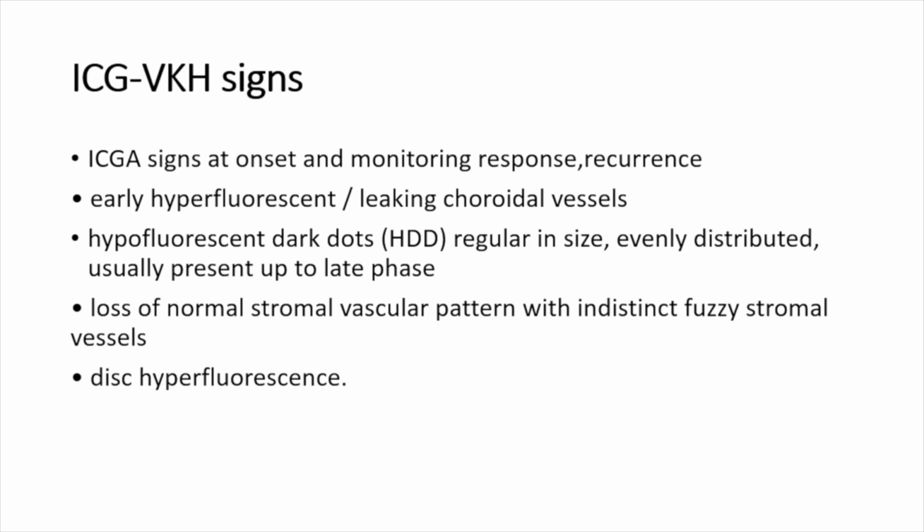But in chronic VKH, we could see the hypofluorescent dark dots, which are seen mostly in the mid to late phase, and fuzzy choroidal vessels are more prominent than the other two findings, like choroidal hyperfluorescence and disc hyperfluorescence. The hypofluorescent dark dots and the fuzzy choroidal vessels will be more in chronic VKH cases.